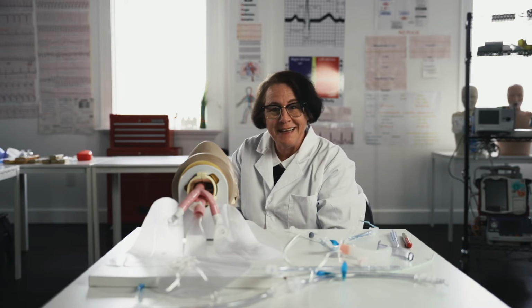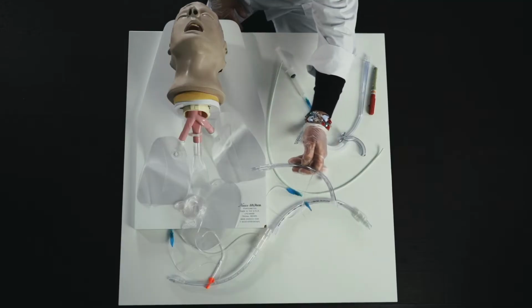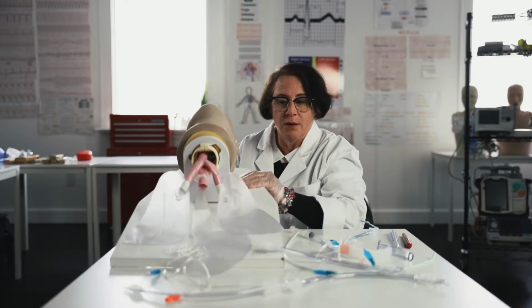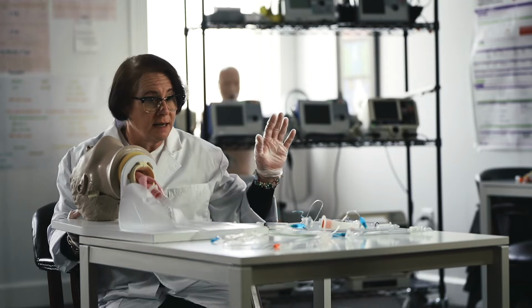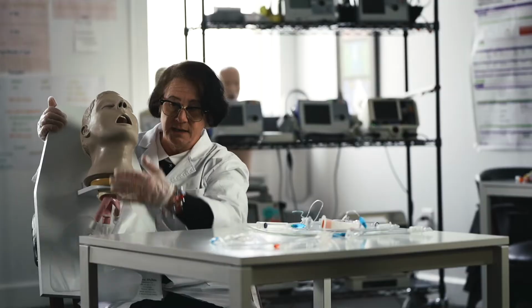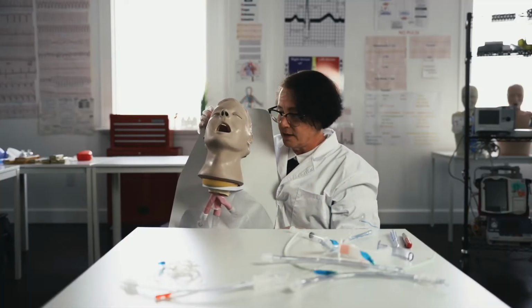Thanks for tuning in. In this video, we're just going to talk about endotracheal tubes, breathing tubes, ET tubes. They have a lot of different names. So keep in mind, when you look at anatomy, it's shown to you backwards. So I'm going to be your patient. This is my left hand. It's your right side. That way you could lay the anatomy book across your patient, chest x-rays, dental x-rays. So everything you see anatomically is shown to you backwards.